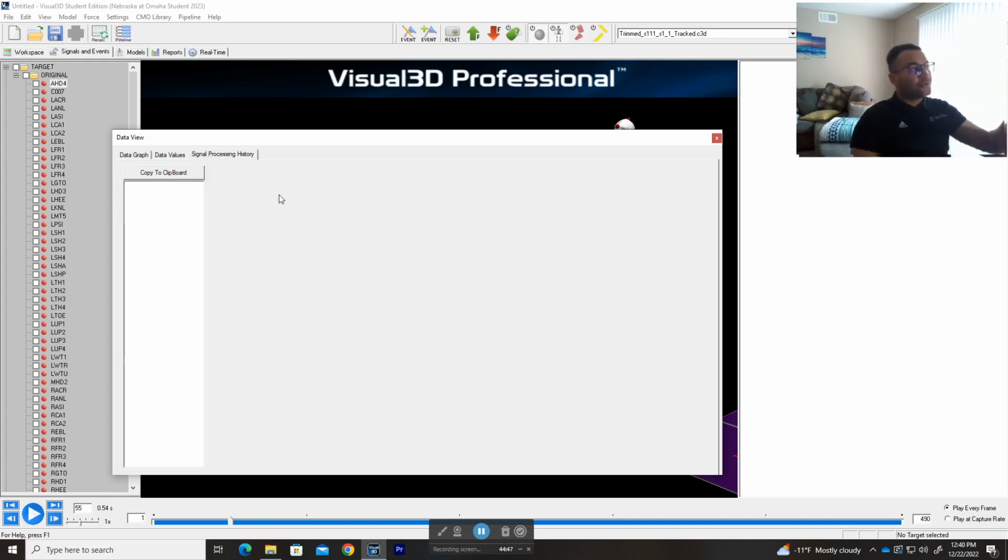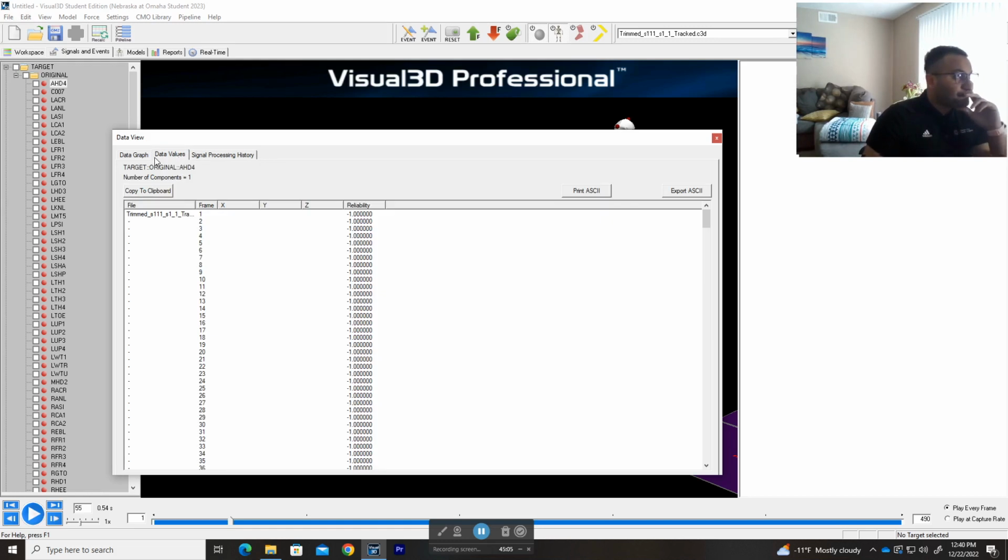Because it is raw here, you don't see anything. But once we start running filters and other steps, it will give you all the steps that we did here. So it's very good to track down what you did if you forgot.